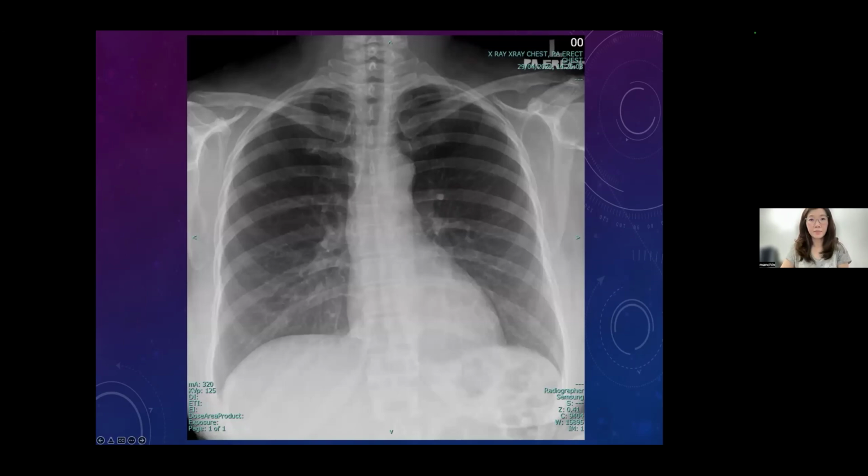Okay, what about this? This is a pre-op chest X-ray, pre-operative assessment. So basically, the patient is asymptomatic. Is it normal? It is not normal. Try my luck. Okay, yeah, one can see. This X-ray I've shown in the last session. I will need eagle eyes to find the abnormalities for this X-ray.